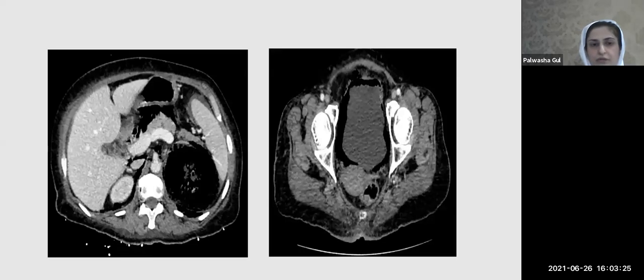Case number 2, a diabetic female patient around 60 to 65 years old. I know many of you would see this and you would say, this is emphysematous pyelonephritis. So what's special about this, okay? I know this is emphysematous pyelonephritis. So this was actually a contrast enhanced CT scan. Of course, we can see a lot of air, which is there, replacing the renal parenchyma as well as in the collecting system.